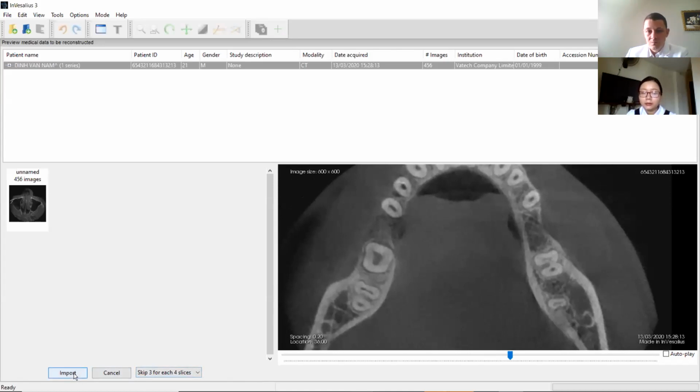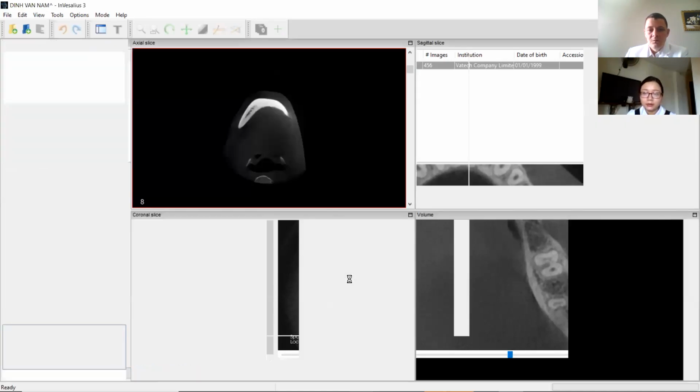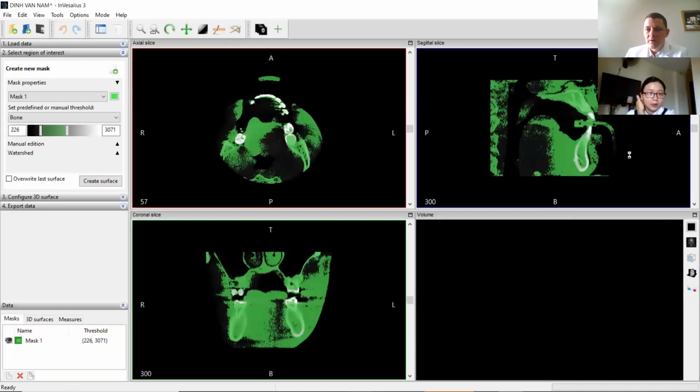Nếu mà mình đã chọn được cái phần đấy rồi thì mình sẽ ấn import. Okay, so import. Okay, so now it starts to be interesting. What you see in green, it's the voxels which are selected.